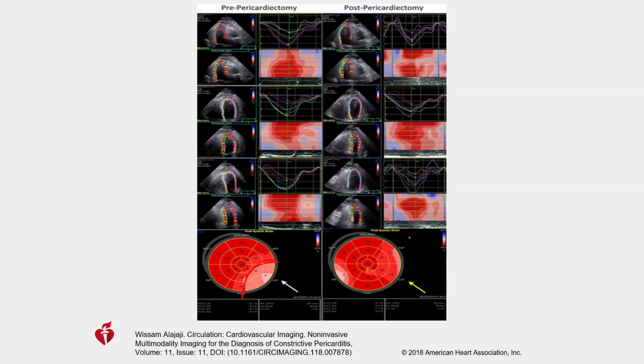And look at the changes post-pericardiectomy. The lateral strain has recovered to a great extent after pericardiectomy. So strain can also help in the diagnosis of constrictive pericarditis.